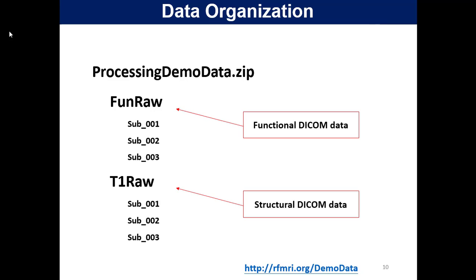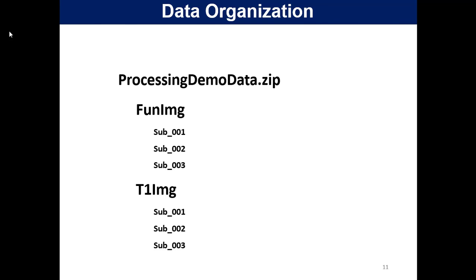That will be a problem. Also, probably both are sub 001, but at the end you have a space. You cannot see that, but the space will make the two names different. This is the most common error in using DPARS, so we ask you to organize your data very carefully. Once you organize your data, the running will be very smooth.